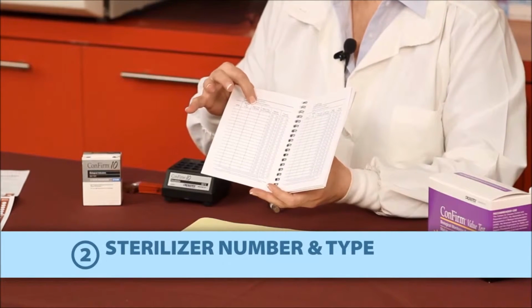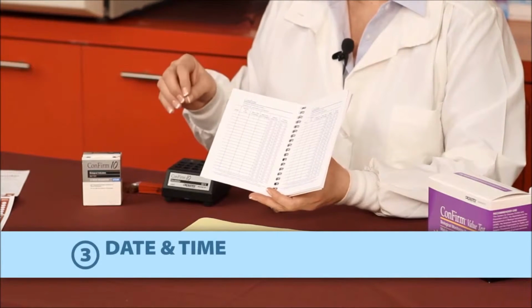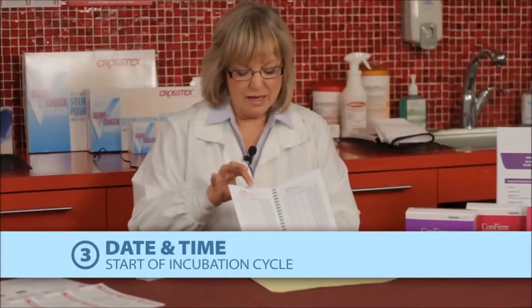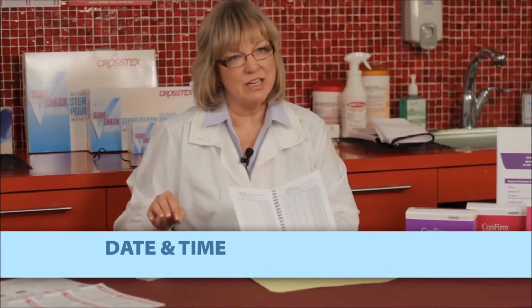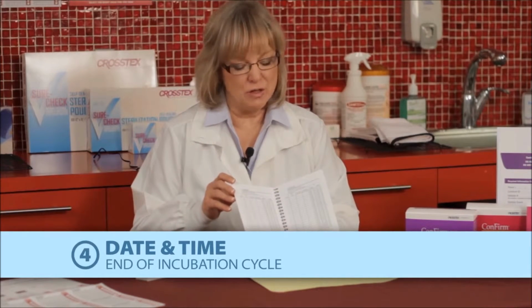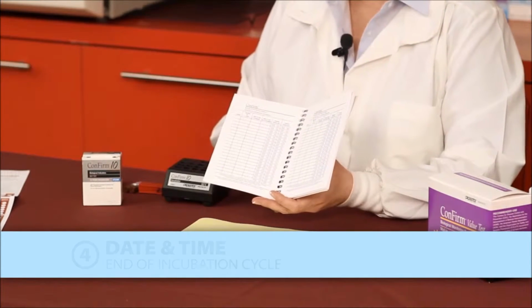The next thing would be the date and the time that you put the test and the control vial into the incubator. And the last column is going to be the date and the time that you removed the test and the control vial from the incubator. Finally, they're going to want to record the result of both the test and the control.